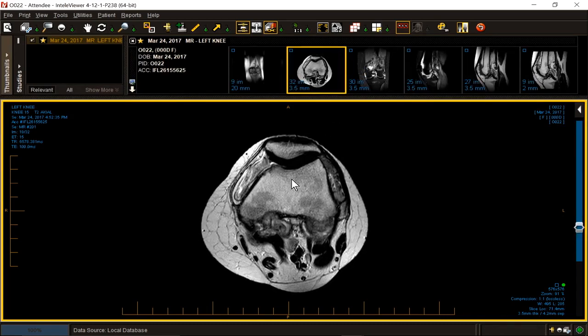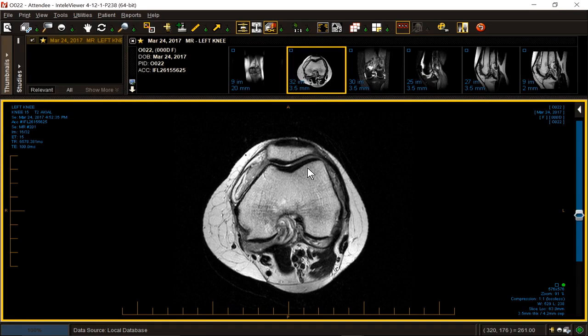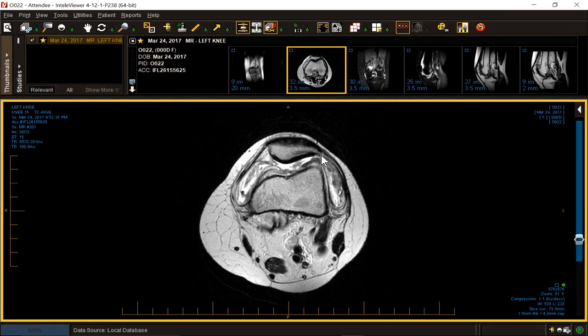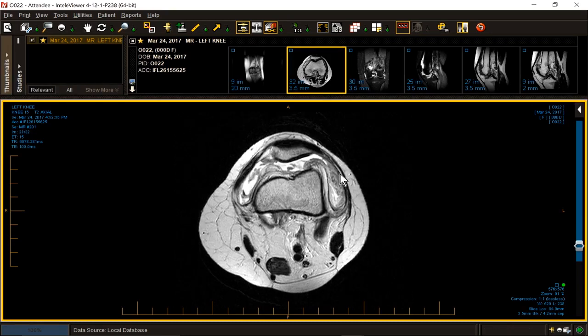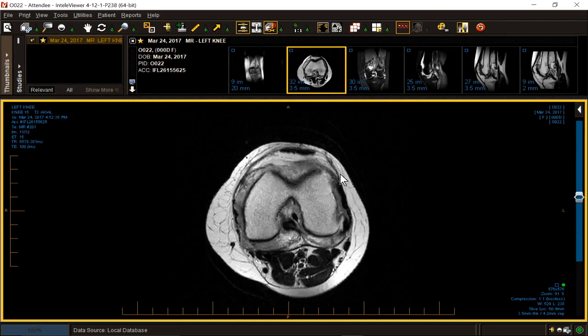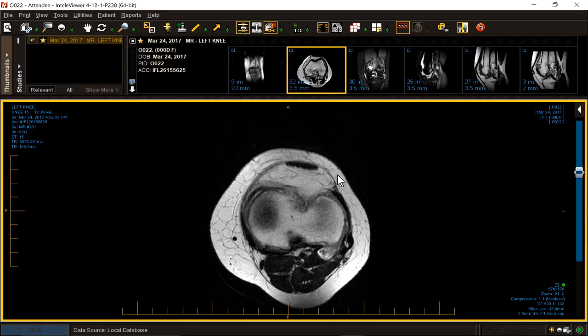Axial. No patellofemoral dysplasia. I take that back. Mild patellofemoral dysplasia. Her lateral femoral ridge is a little tall. She's got a little extra tubercle along her lateral facet. MPFL, fine. Medial retinaculum, fine. Lateral retinaculum, fine. Effusion, complex. What's in it? What could be in it? Gout? I don't think so.